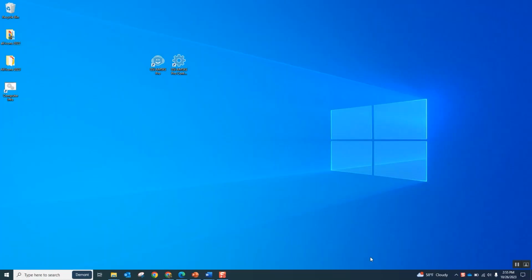Today I'm going to talk to you just a little bit about how to configure your GSI AMTAS Pro before you actually run any evaluations. So we're starting all the way on the desktop.